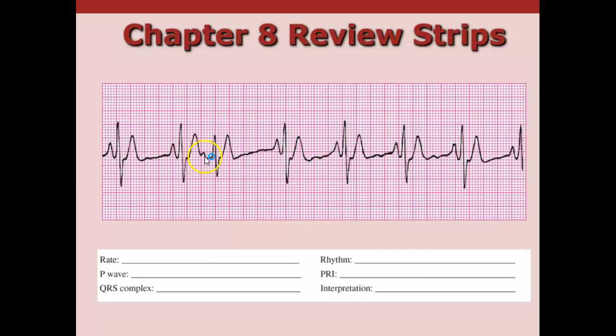Looks like the P wave, you can see how this T wave has been altered, has a P wave there. It is a premature beat. And we would expect it to be here. It looks like probably everything's just clicking right along as it was going. So sinus rhythm with a PAC. We have a premature atrial complex. So sinus rhythm with a PAC.